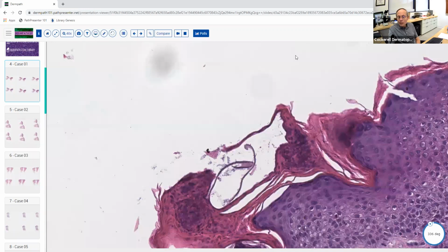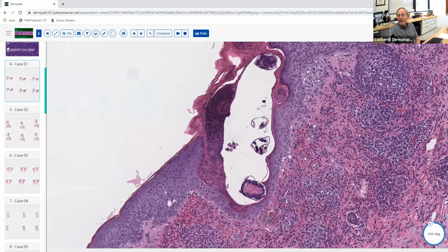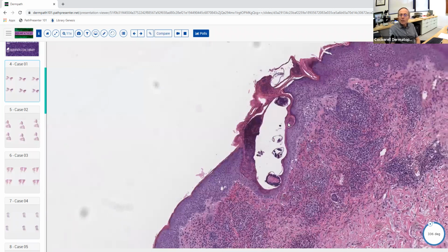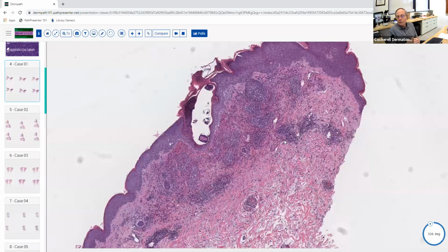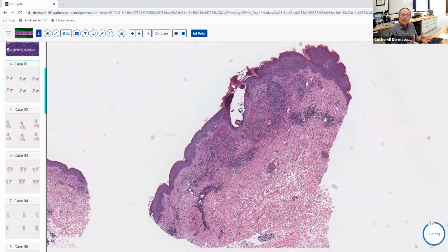And there's one other product of the mite, so-called scybala, which is the fecal material of the mite. And if you see that in the cornified layer in a little dell, like a burrow, like you see here, that also is diagnostic of scabies. Now, this is an interesting pattern because of the classic pattern we talk about with arthropod assaults. The organism is assaulting your skin and attacking it. So it's not really a bug bite in a way. Scabies is not a bite, it's an infestation.